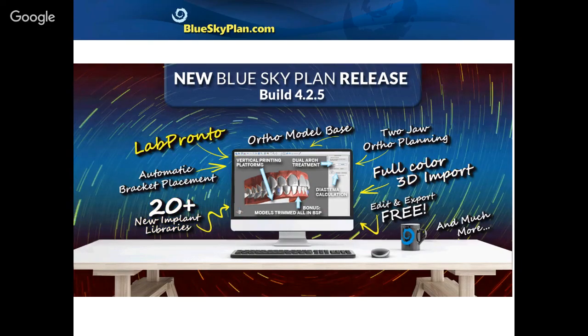We also have other functionalities such as the ability to now import a full color 3D scan, an OBJ file. We've added many implant libraries and guided surgical kits. So go ahead and download the software if you haven't yet.